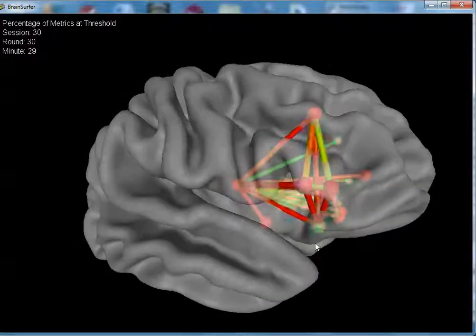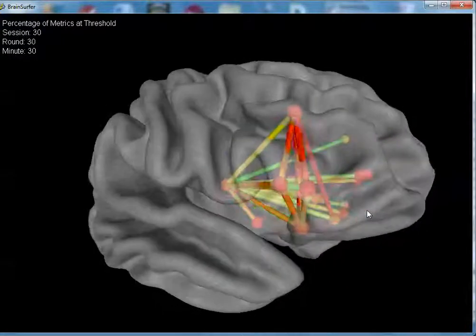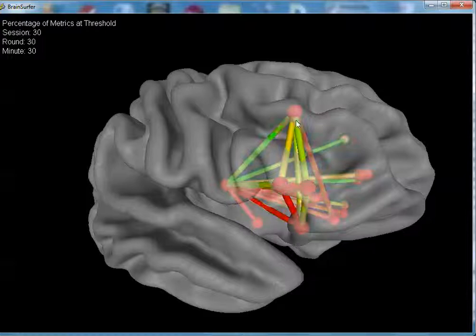The purpose being so one can see what the addiction network looks like in 3 dimensions. One can zoom in to particular nodes, which are Brodmann areas, and the lines between the Brodmann areas represent functional connectivity as measured by coherence and phase.